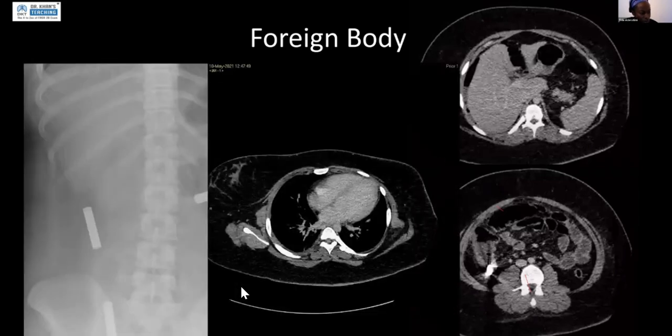She had a subsequent x-ray, which I've not shown you, which also showed that this battery here was not moving. It was just staying stuck here, and she was clinically deteriorating with worsening abdominal pain and fevers. So she went on to have a CT, which I can't show you, unfortunately, in the video, but this is that battery here. It has perforated through the bowel and ended up in an extraluminal position. And you can see that she's got pneumoperitoneum in the abdomen secondary to this.